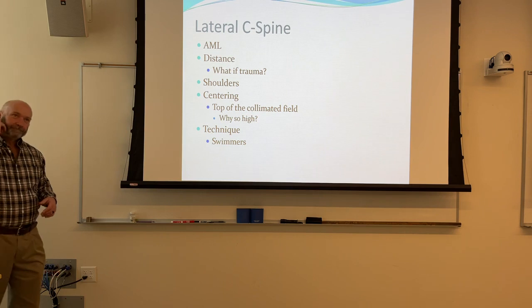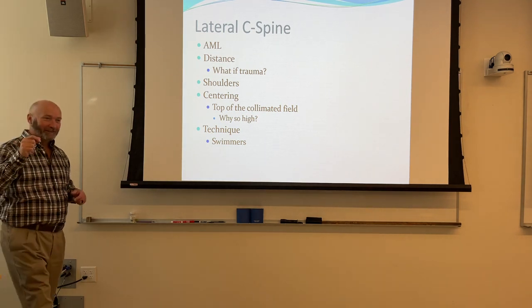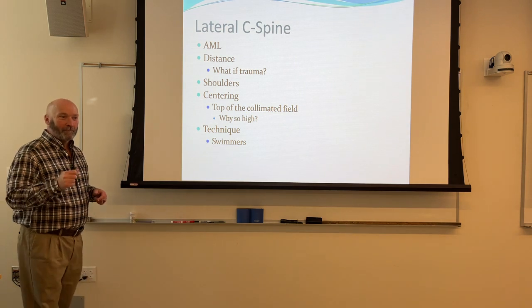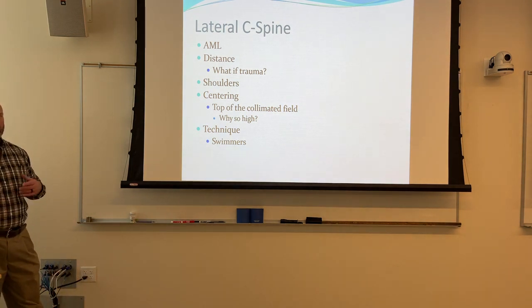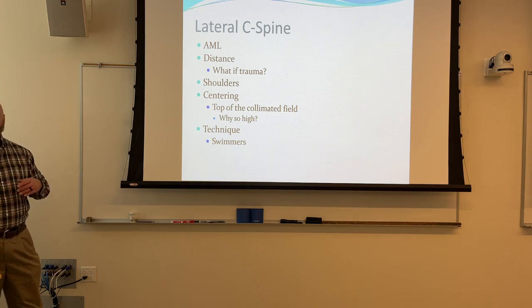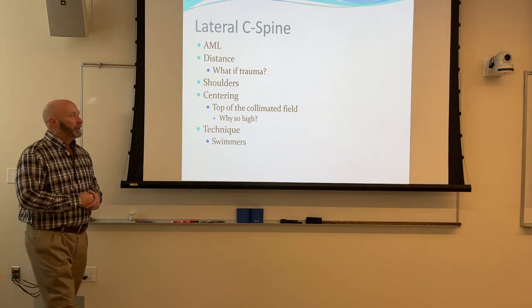Swimmers, I'm not saying swimmers is useless. It's less useless than a fuchs. But it's an ugly x-ray, and the only thing it really shows you is alignment, right? And we're going to take a look at that here in just a second and possibly introduce another little tip that you might want to incorporate. Also, don't see it in the textbook, okay?